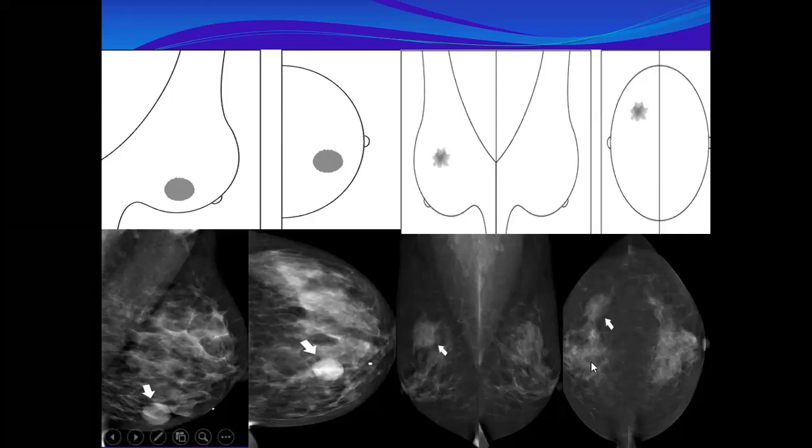But if you look, the shape is not a persisting shape, as we described before. This very small area looks like a convex border, otherwise it has concave borders. A mass should not have concave borders. You can see part of the fatty tissue going slightly into the borders of the lesion, not very clear, not in depth.